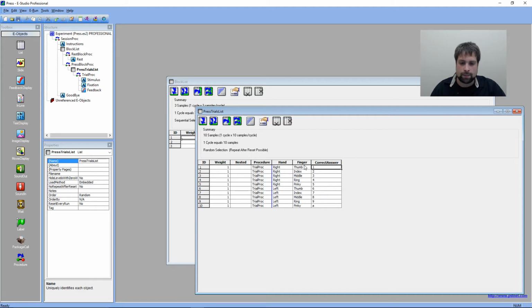So for example, the right thumb on the hand unit would be denoted as 1 in E-Prime. The right index finger is 2, middle finger is 3, ring finger is 4, pinky is 5, and thumb is 6. With the left hand, it keeps going from 7, and then instead of 10, it's actually an A. That's just how our Celeritas unit logs these. Obviously, you can't really set your fingers up to have your left ring finger on the 9 key and your left pinky on A, unless you have really gigantic fingers, in which case it's impressive. But this is made primarily for that Celeritas device, so that's why those are set up that way.